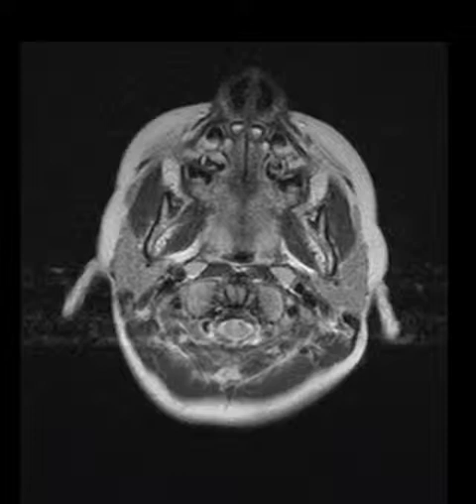So to orientate you, the patient is lying down on their back, where the feet are towards you and the head is towards the screen. This is anterior, posterior, right, left.